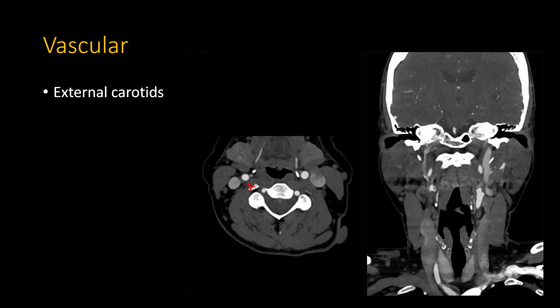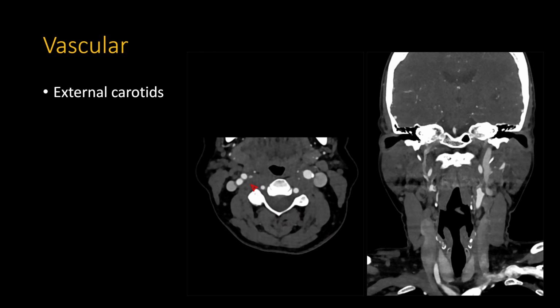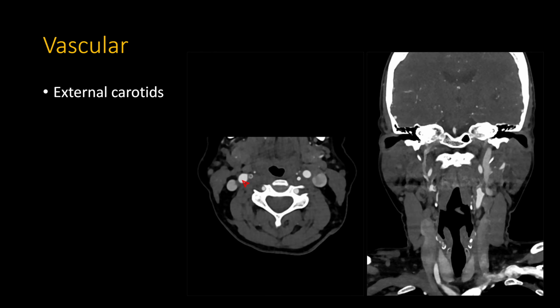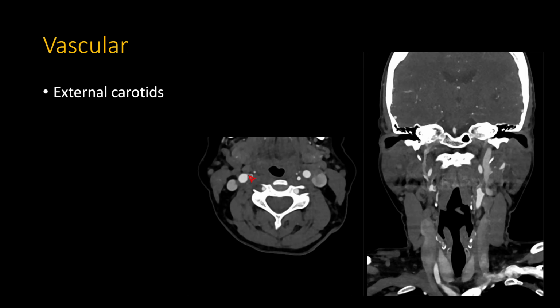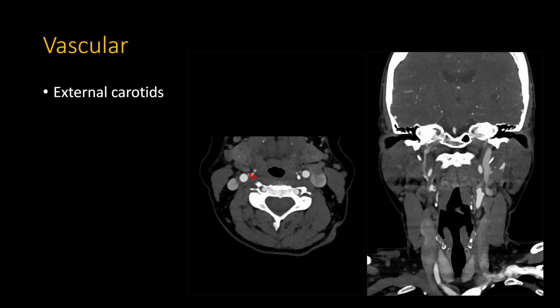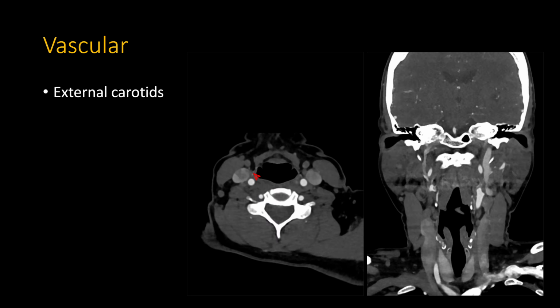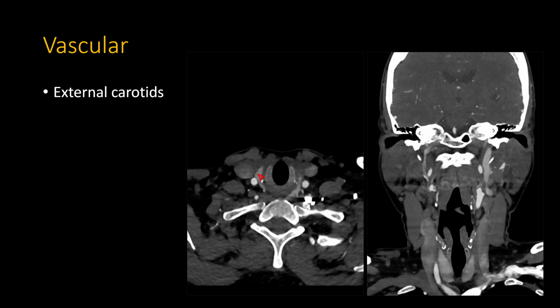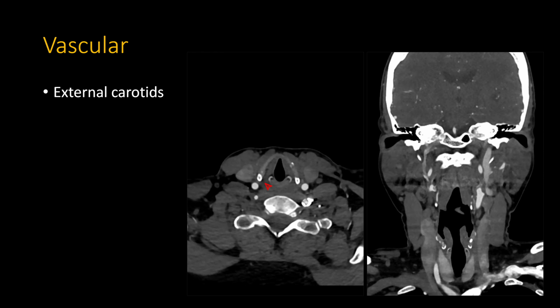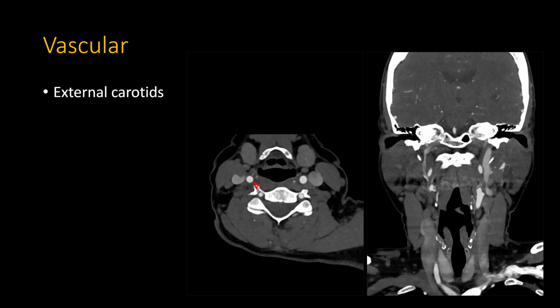So there's lots of branches from the external carotid arteries. We'll go over them sort of inferior to superior. So here's the carotid bifurcation, and here's the external carotid coming off. One of the first branches is the superior thyroidal artery, and this is it right here. This branch, we can trace it down. It comes off really at that undersurface of the external carotid artery right after the bifurcation, and it goes inferiorly, and as the name implies, towards the thyroid gland right here. So that's it right there. That's the superior thyroid artery.